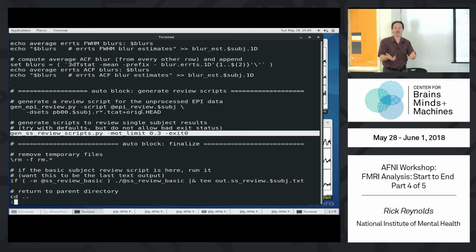So again, for your first couple of subjects, I recommend doing everything we are doing here and maybe a little more in depth. But once you're happy with the processing, and you think things are working like you expect them to, you can just do quick quality controls. That's a couple minutes per subject. We'll do that in a minute.